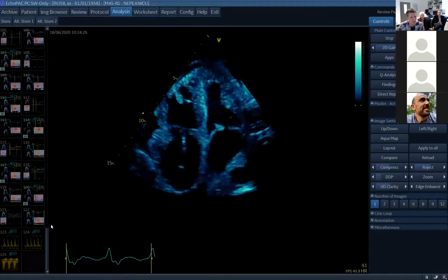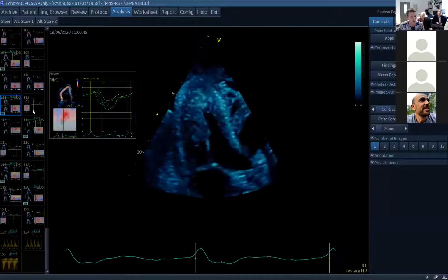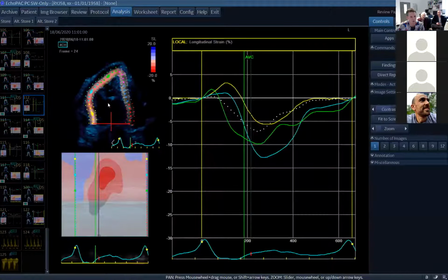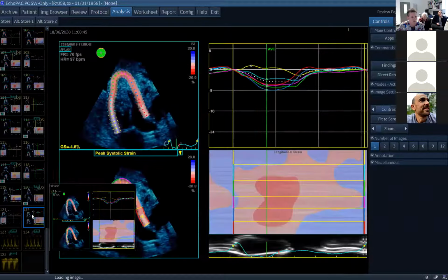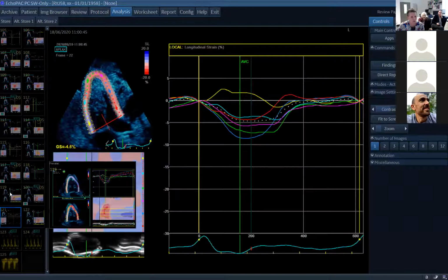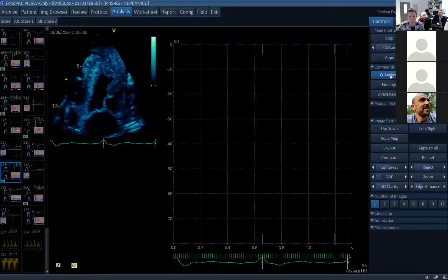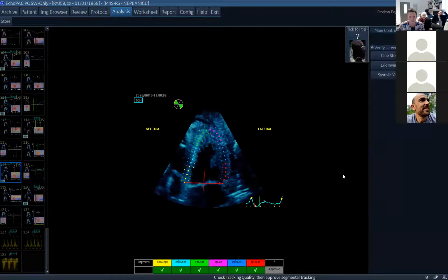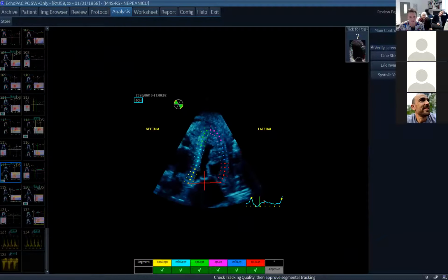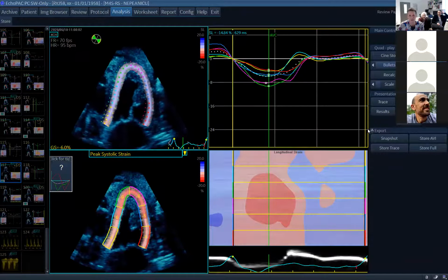at the end, which is just a bit of a, I don't know if I've actually got the little bullseye plot. There it is, cherry on top. So we've kind of got pictures here. You get the cherry on top. I don't know if I've actually got the bullseye. Maybe I could. Yeah, you do, Dan. I think so. Sometimes if I go Q analysis, no, 2D strain. No, sorry, I don't have it.